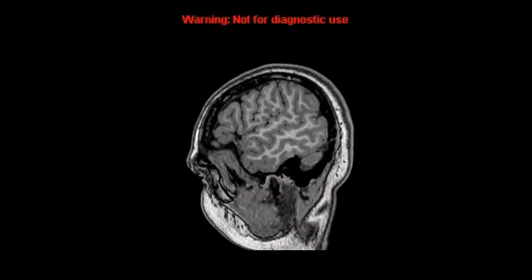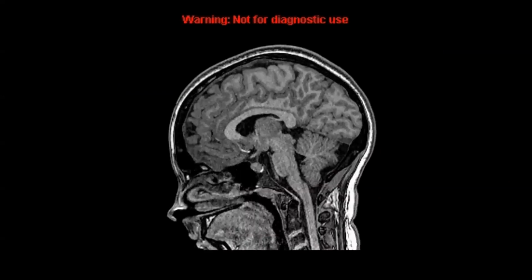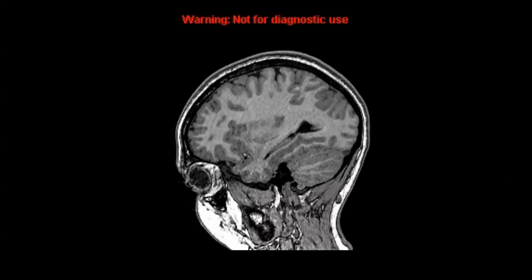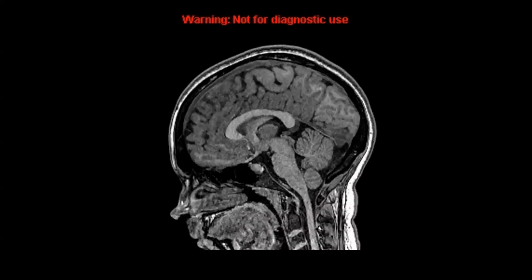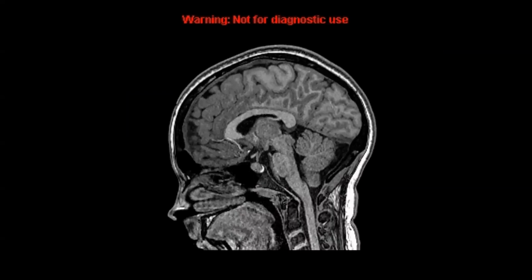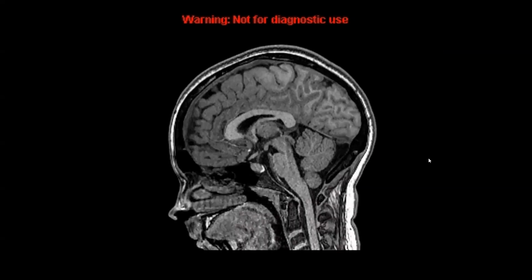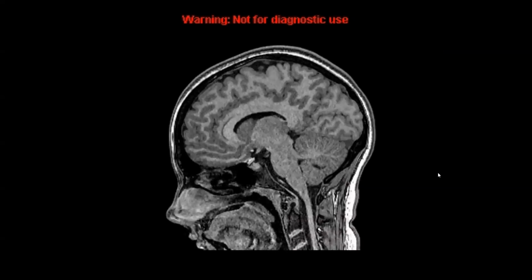And that's seen here. This is actually an MRI. It was just more accessible as a scrollable stack when I made this video than a CT was, but it delineates the anatomy probably even better than a CT. So again, we're in the midline here. We can see all the midline structures in that sagittal plane. Here's anterior, here's posterior, and as we scroll through, we're moving from right to left and left to right.